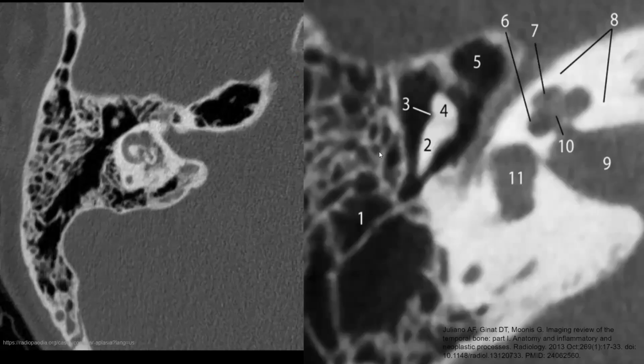And then we see a congenital issue here. On the right hand side of the screen again is our normal example, and we see a normal cochlea. It has this clover leaf appearance. And then we see a normal vestibule here. We don't really see the semicircular canals, but probably part of it is poking out here. Here's an abnormal case. In this case, we see part of the semicircular canal here, but it looks distorted.